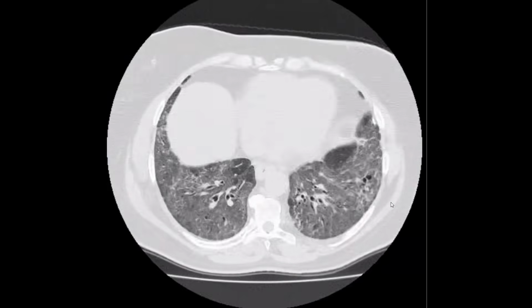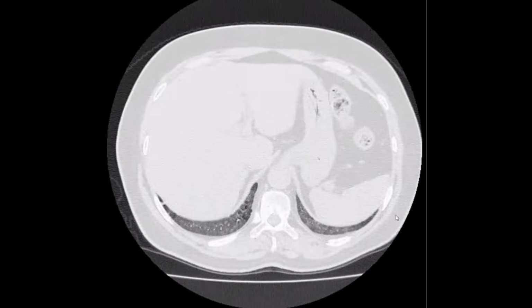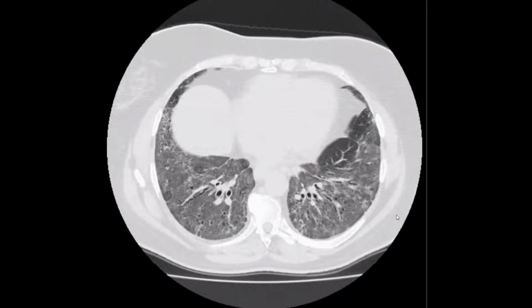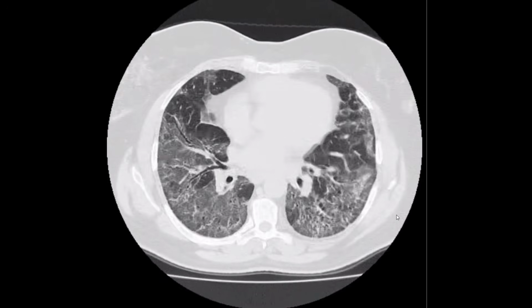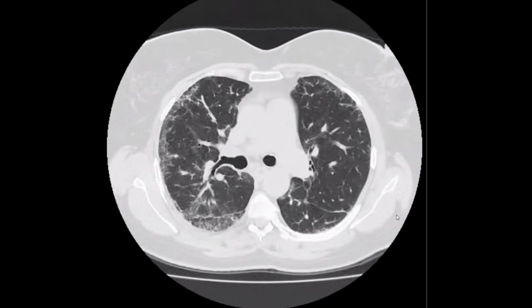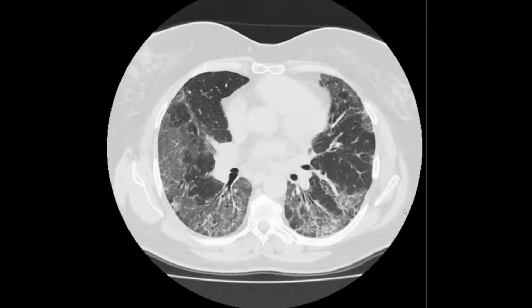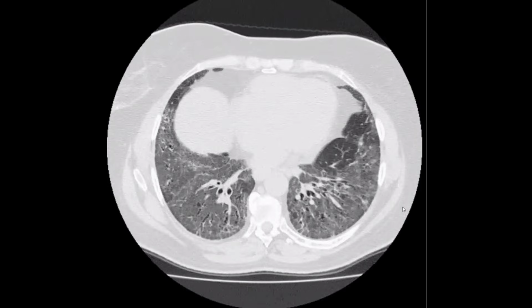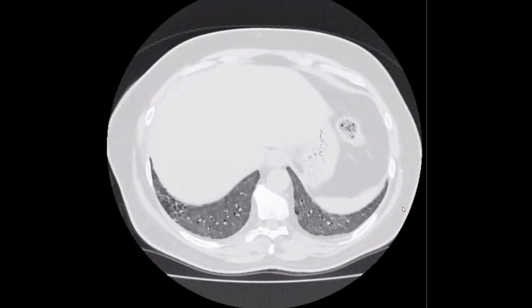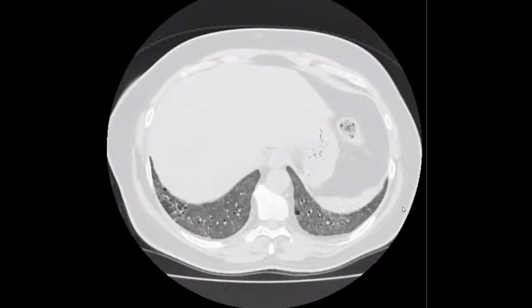The CT scan axial post-contrast study. This is the lung window in which I can appreciate that there is bilateral symmetrical ground glass haze noted in both lung parenchyma, both lower lobes with the bronchiectatic changes as well. Traction bronchiectasis is also noted. These are more pronounced in the mid and lower lobes and in the peripheral location as well.